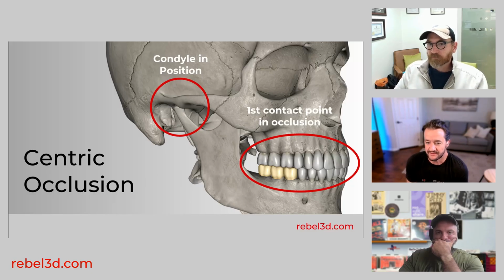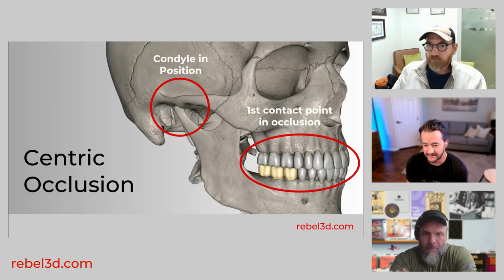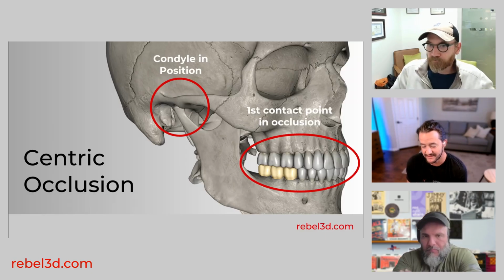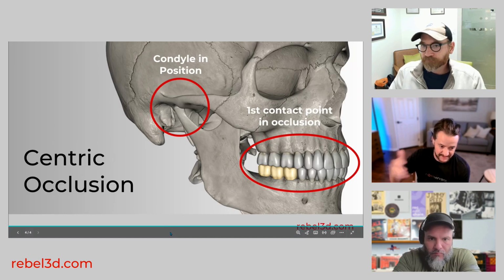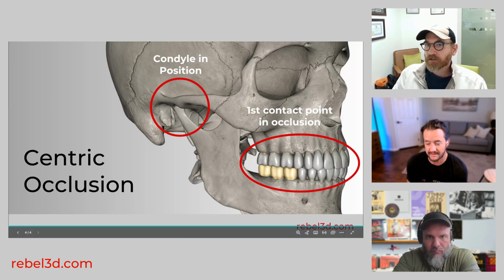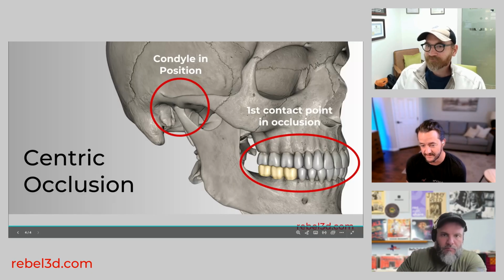Well, let's jump into a case. And, Daniel, you've designed thousands of cases, a lot of full mouth, a lot of All-on-X, and doctors give you bites and then they ask you to mount it and sometimes open it. Just wanted you to show us the process of what you commonly get, what those common requests are. And then let's talk about, Daniel, from your perspective as a designer, what are your concerns about opening the bite? And then Dr. Sven, you'll share after that what you do.